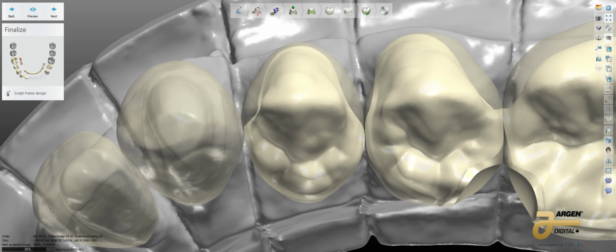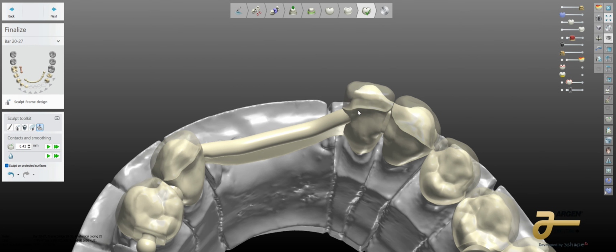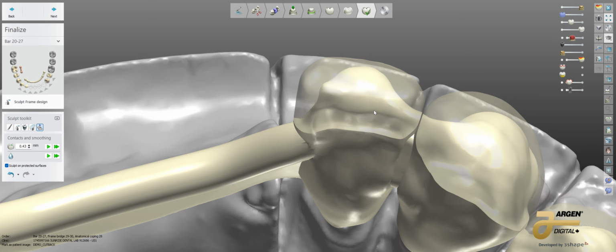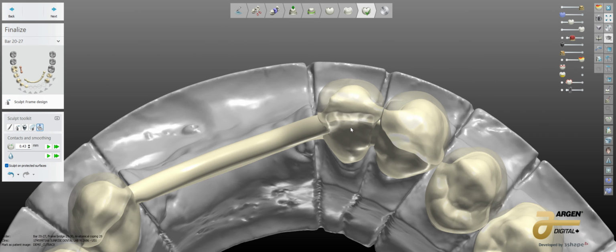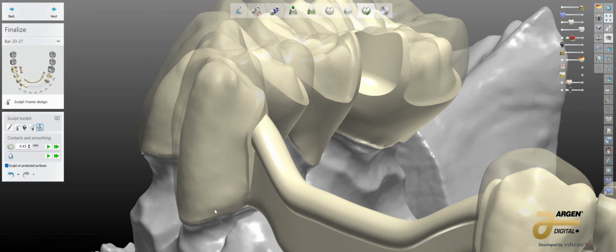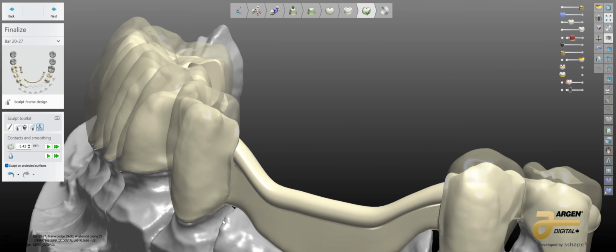I want to be able to maintain the sharpness of this design based on how I've brought those splines up for the cutbacks. You can see rather clearly we got some very thin sections here. And anybody that's stacked glass, and stacked glass on chrome, understands the chemical challenges of this material based on the oxide that's going to be formed and how the opaque is going to bond to this.